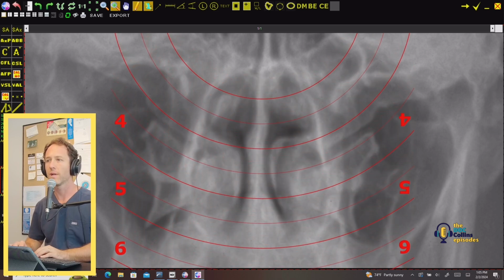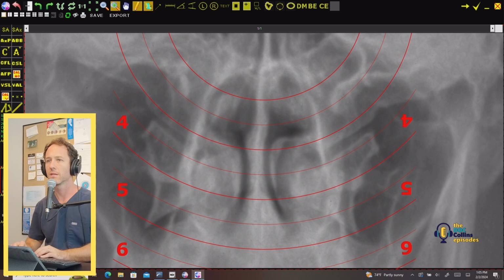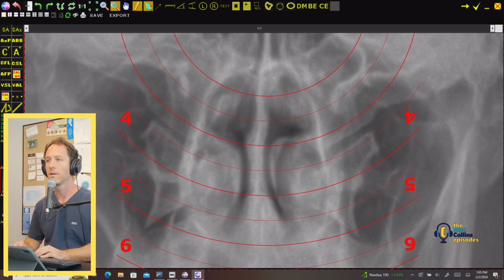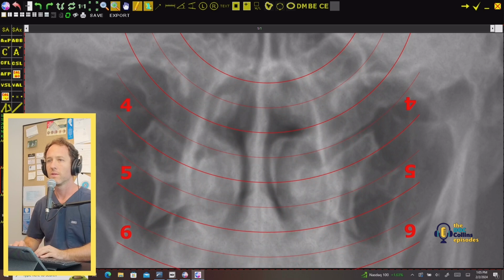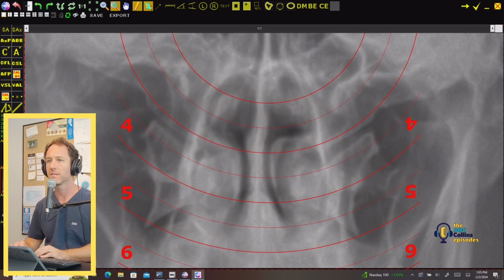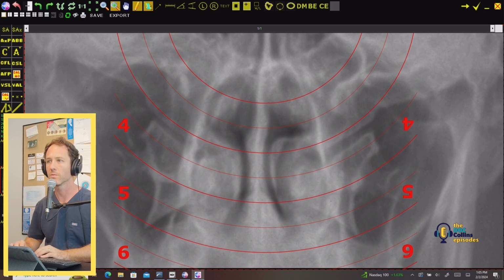So the lateral aspect of the condyles is what we're looking at, is why I bring that up. Even though the template will cover the entire condylar circle, really that lateral aspect is the weight-bearing aspect that we're most concerned with.